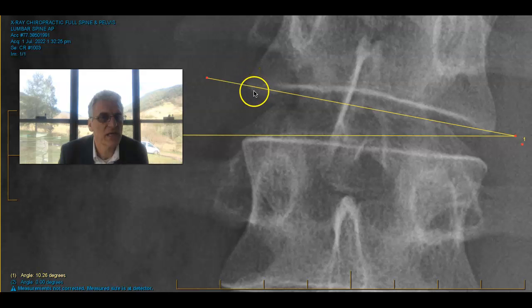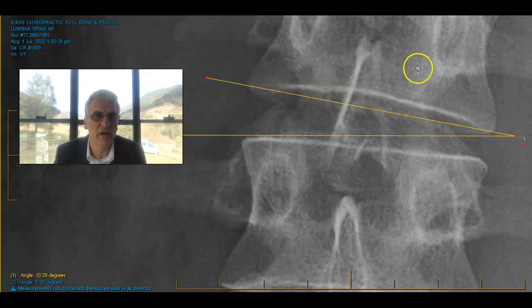All right, notice how it changes its direction at those 2 points. 10.26, again, that's fairly accurate in terms of what I want. And I want that feedback to know that am I doing the right thing or am I not doing the right thing?